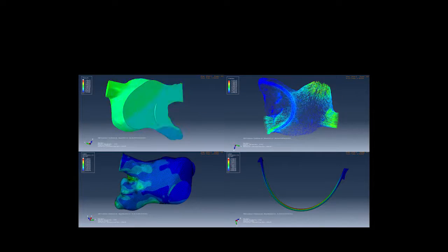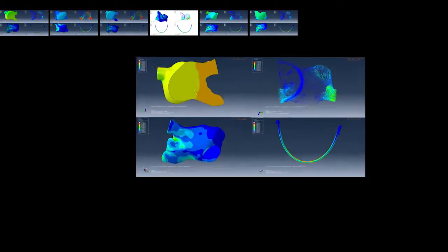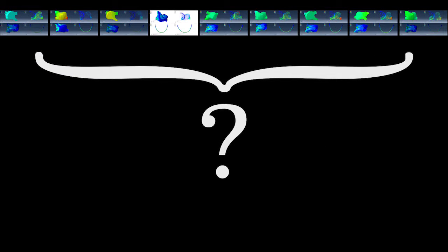These are computer simulations of blood flow interacting with a cardiac lead within the right atrium of the heart. Medical device engineers want to simulate 10 heartbeats. In each one, a different lead is used, changing the stiffness and length parameters to explore the design space. If we could only understand the differences that show up in the results, then we could design leads that are more effective and last longer.